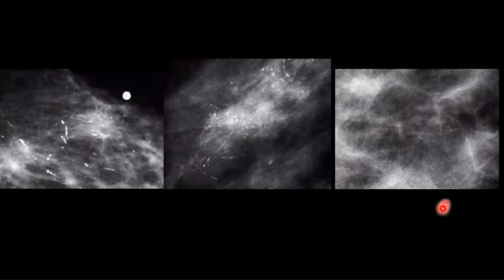Again, a different patient. This spot compression magnification view demonstrates many low density linear calcifications. You can see tiny dots here and there. Linear calcifications, okay? Regionally distributed. These patients illustrate the variability that can be seen in the size and the density of the calcification associated with DCIS, within and among the lesions. So all of these, this one, and this one, all of them are ductal carcinoma in situ, DCIS.